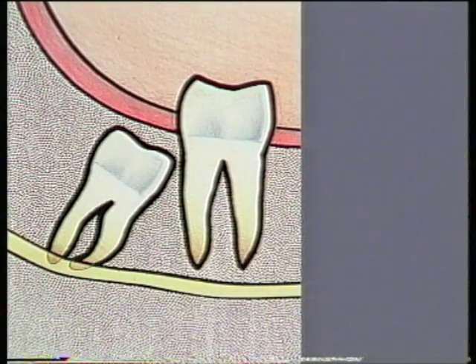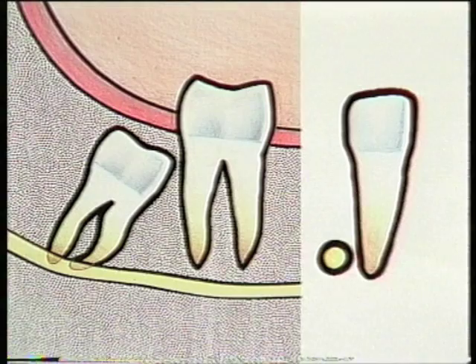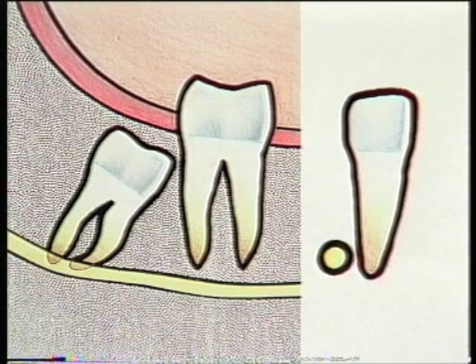In this case, the inferior alveolar nerve can be seen superimposed on the roots of the third molar, but in tracing the canal outline, no break in continuity, or narrowing, or deviation can be seen. From this, we may safely say that the nerve is lying lateral to the roots, but is not intimately related to them.